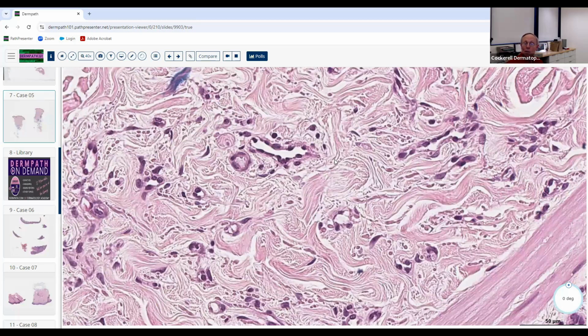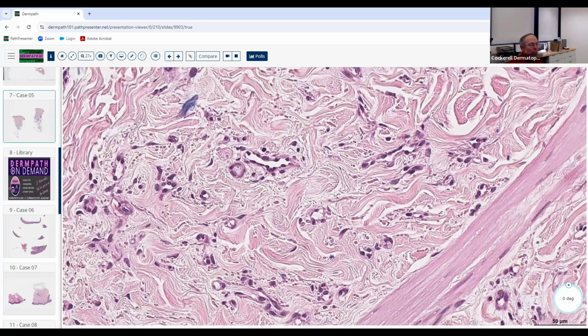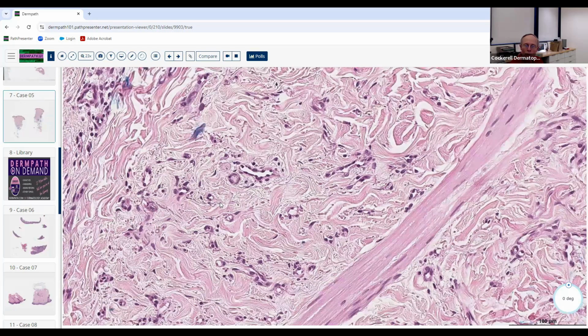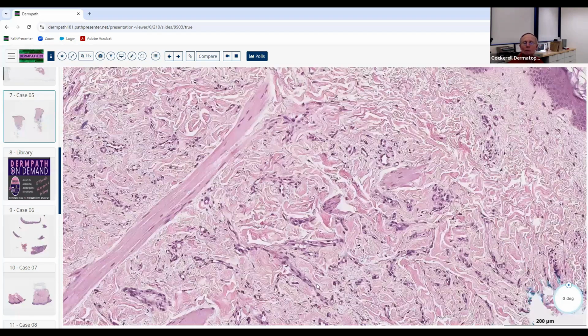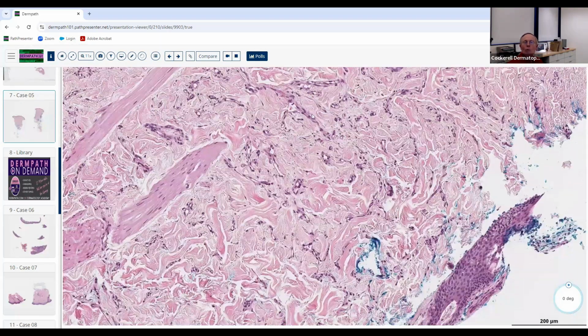And some of the features that you just mentioned are correct. You usually see well-defined blood vessels. There are too many per unit area, but each one of them is relatively well-defined when we look at it. And they have these prominent endothelial cells, and you do not see spindle cell morphology. You don't see dissecting, diffuse, poorly defined vascular channels dissecting throughout the collagen bundles, but you do see a lot of these blood vessels per unit area over a diffuse broad area. And so that's really the way that we distinguish these from one another.